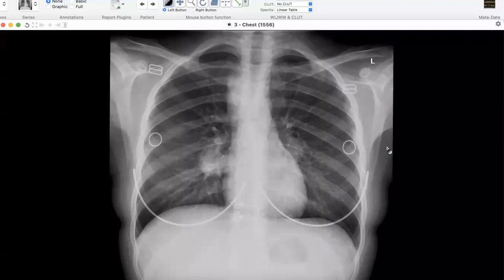I agree that for the final diagnosis CT will be very helpful, but I want to hear your full differentials for this sort of appearance and the summary of the findings. Is this the only finding you're concerned about, or did you see any other finding? Yeah, I can see there is another right paratracheal increased density, which is longitudinal, and it is well outlined in the outer border.